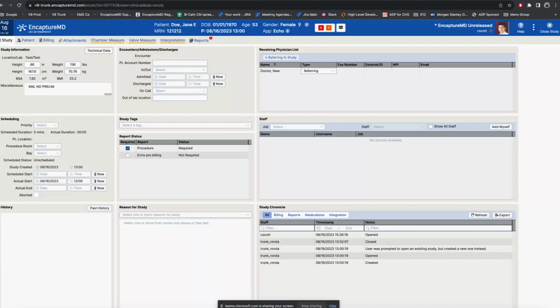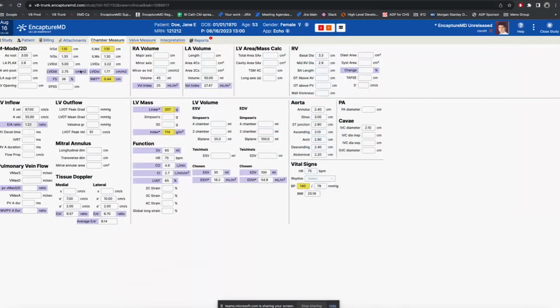It starts out with a bunch of information that comes from the ultrasound machine. That would include information about the order for the study. That would have the patient's name, date of birth, medical record number, and other identifying numbers. Also, the ultrasound machine is generating a lot of data, and that would be things that are entered, like the patient's height and weight, plus all the measurements that were performed on the study.